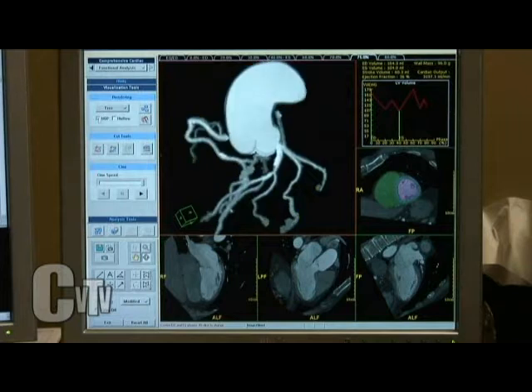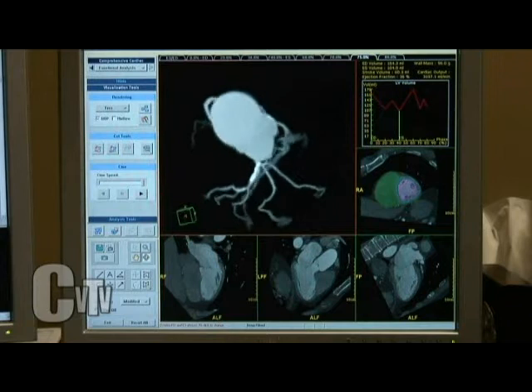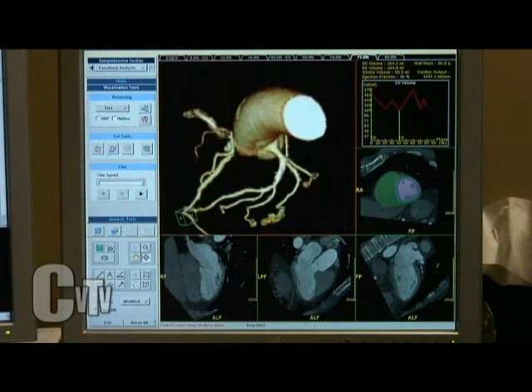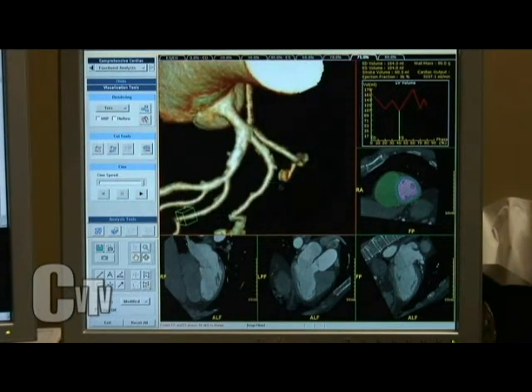We can look on the inside. This is the inside of that plaque. It's like a hydra from biology. Yep. And there's the outside. And note, this stuff is growing in the outside, fortunately for him, because that's how plaque grows.